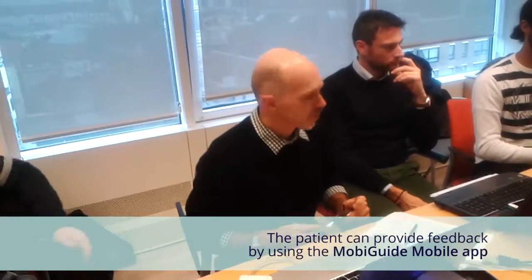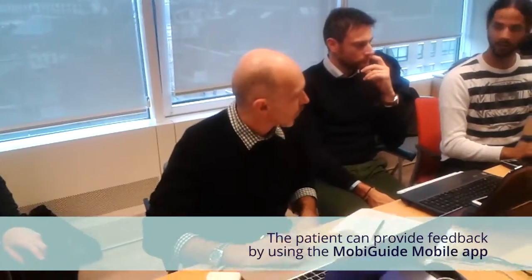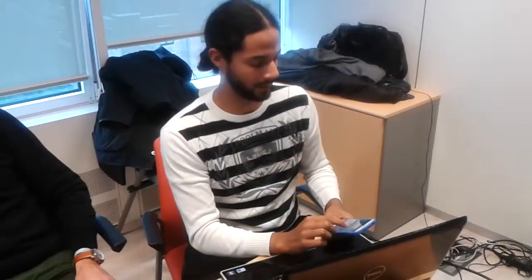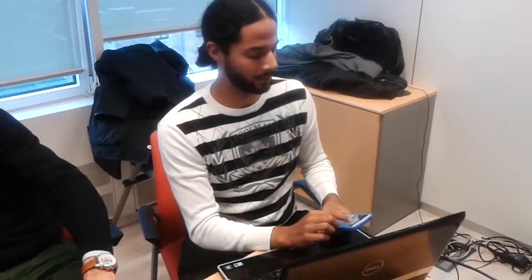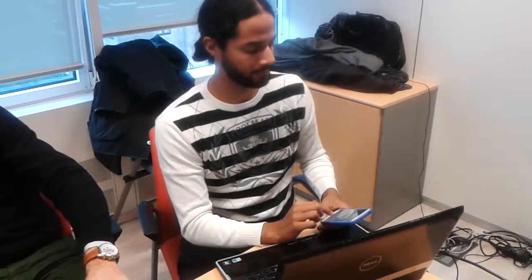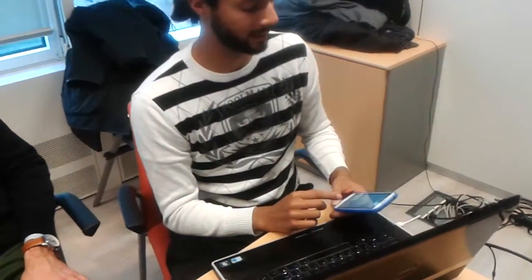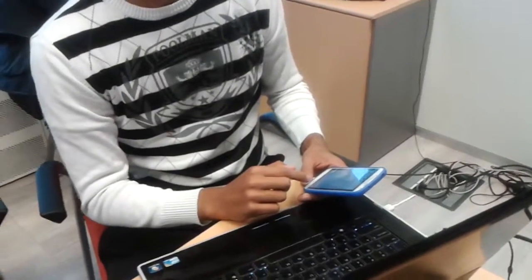So the patient with the mobile has to switch it on. So basically, I'm going to report a symptom, and I do this by clicking the 6 smiley at the top, and I'm going to insert palpitations of a level that are unacceptable.